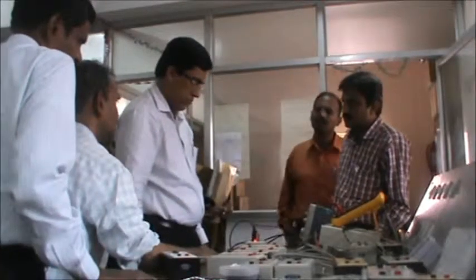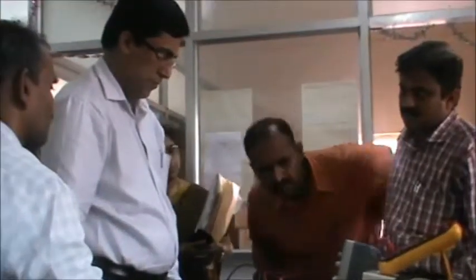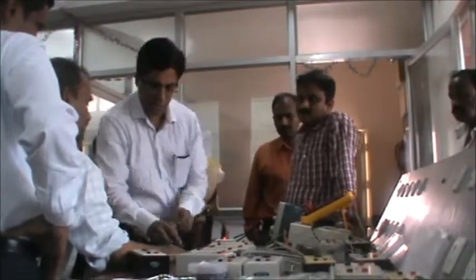Steady state. Steady state. Ambient temperature. I'll just connect myself.